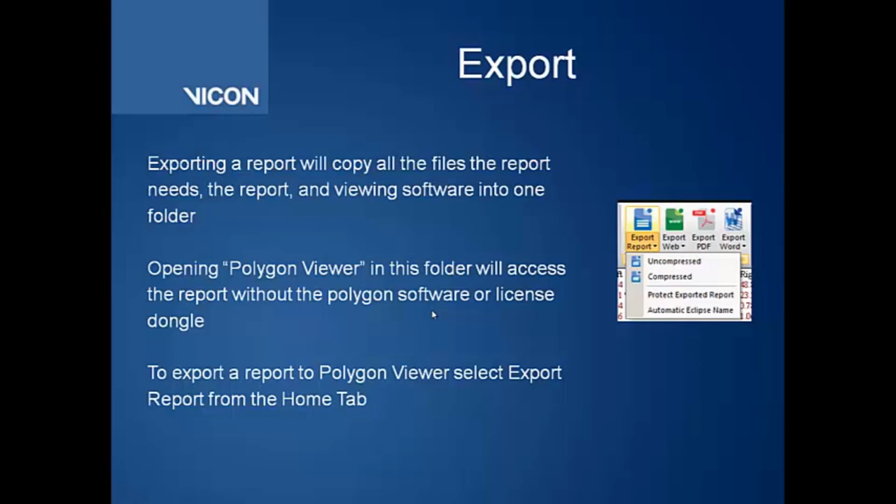So the final thing that we want to cover today is exporting options. How you can export your report to use it in other softwares or anything like that. You have several options in this. If you export a report through just the Export Report button, it actually will save a copy of each file associated with the report so that it can open on any computer that does or does not have Polygon. It saves this Polygon Viewer software so that you can open it without having any sort of license for Polygon. You can navigate through any of the links, they will all be active. You can watch the videos, you just won't be able to make changes to it.